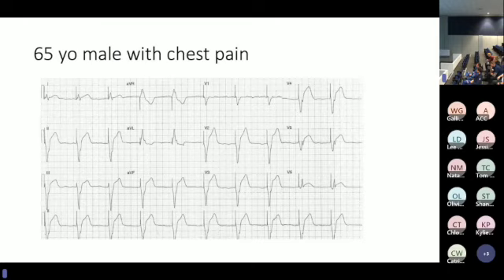V6 is inappropriately concordant, and lead 1 is also inappropriately concordant. I don't think the ST elevation is excessive, but it's 25% or more of the preceding S wave, I think that's probably pushing it. Open to ideas, but I probably would.